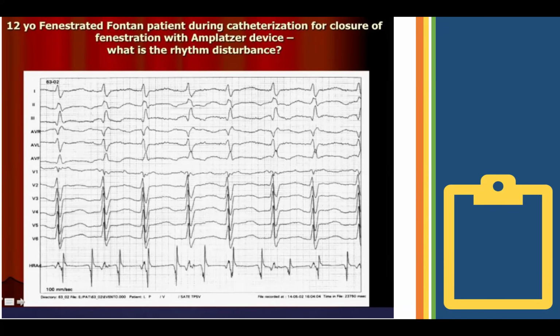So I'm wondering if there's a prolonging between the P and the QRS, and then a drop versus block. But I think we're looking at a Wenckebach type picture. Yeah, so prolonging of our PR and then a sudden drop. That's right. I agree with you.